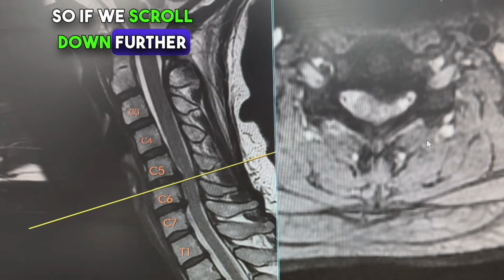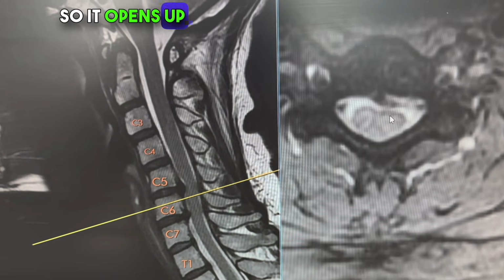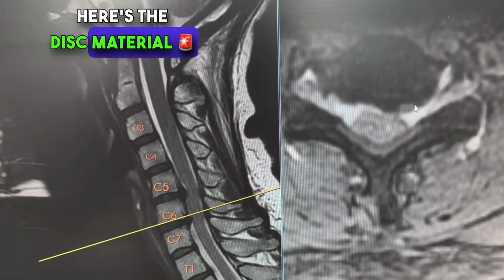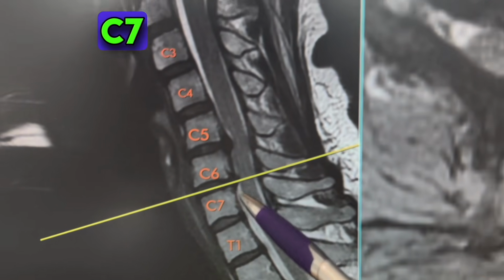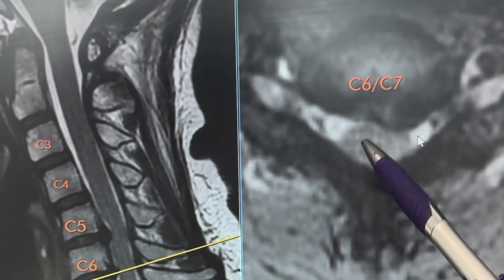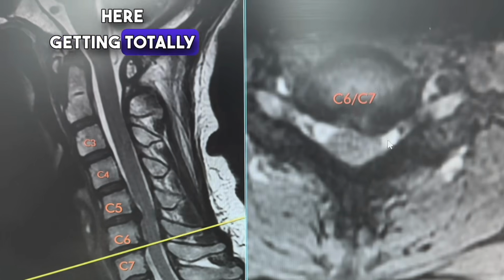So if we scroll down further, it's going to open up again. Well, there's that big disc material. So it opens up again, and going down to the next level at C6, C7, here's the disc material, this black stuff, and boom, there's this next level. So it's C6, C7 on this. Again, looking down, here's the spinal cord, white fluid around it, spinal cord, white fluid. Here's the nerve tunnel here, getting totally compressed.